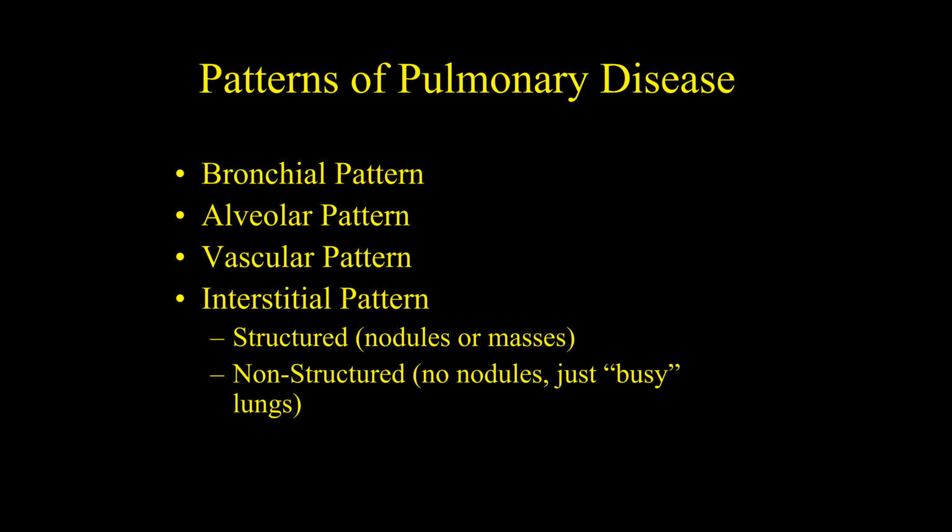Okay, here are the different types of pulmonary patterns that we're going to talk about. And this can become very confusing. You would think, just intuitively, that the thoracic region is much easier radiographically to evaluate, because basically there's only 2 things in the thorax, the heart and the lungs, as opposed to the abdomen, where there's all kinds of stuff going on. But a lot of times I think that reading thoracic films is actually more challenging than reading abdominal films. We'll see what you think after we get through talking about the thorax and the lungs and then the abdomen.